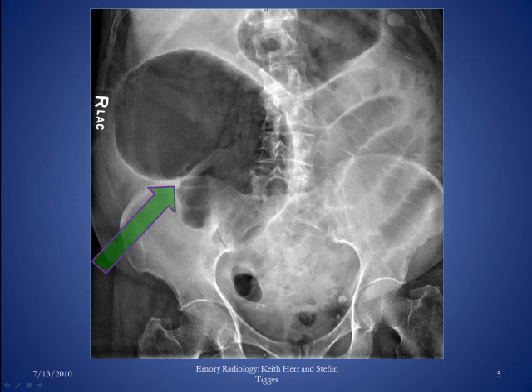In addition, due to the inability of bowel gas to pass beyond the twisted cecum, dilated loops of small bowel are seen in the left hemiabdomen, representing small bowel obstruction. The small bowel is confidently identified by the presence of folds which span the diameter of the bowel lumen. These folds are known as valvulae conniventes.